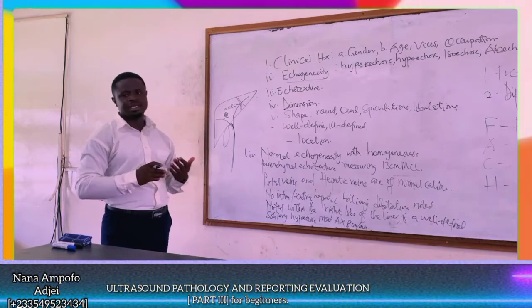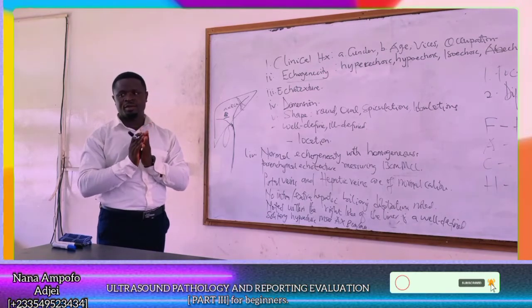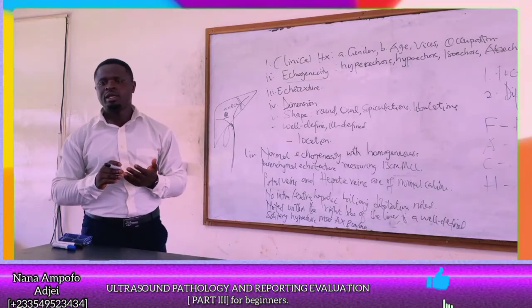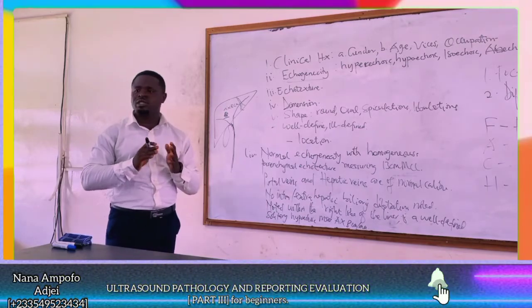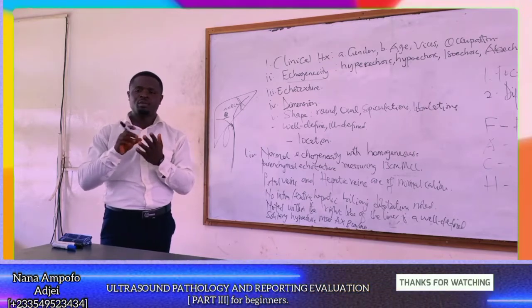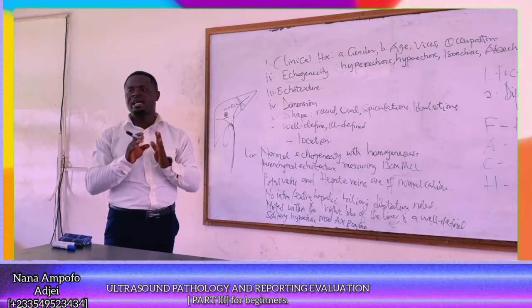So for acute hepatitis like this, the sonographic appearance is decreased echogenicity of the liver parenchyma, with increased visualization of the portal vein walls. The parenchyma becomes hypoechoic, and then the portal vein is hyperechoic, with accentuated brightness, appearing as a starry sky appearance.